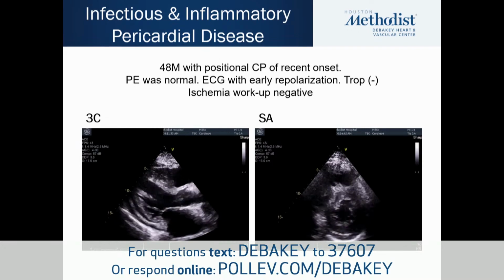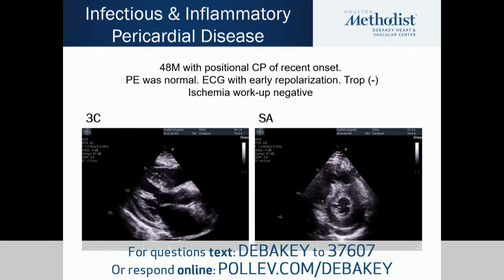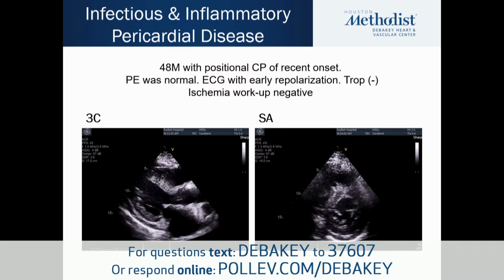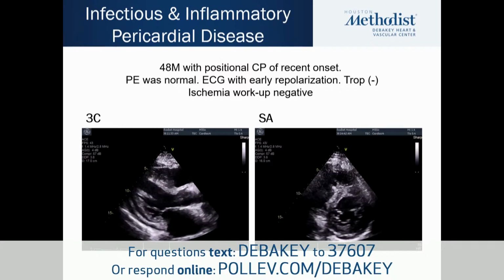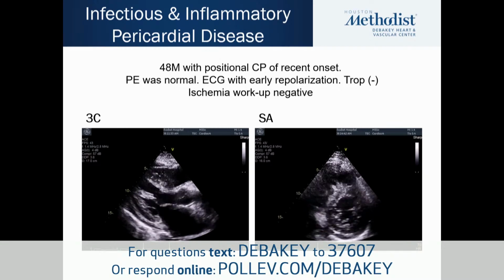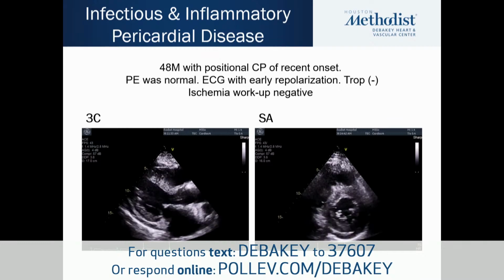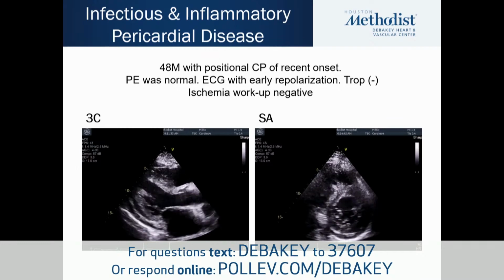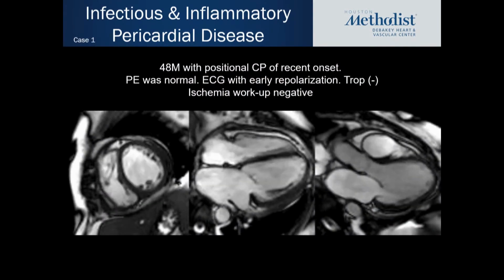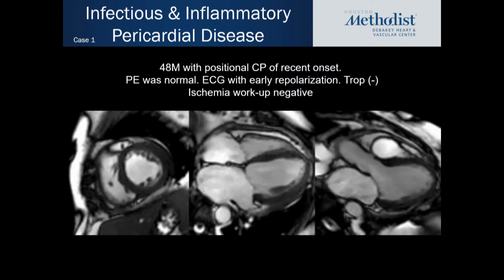And here are his ultrasound images of his heart. I think y'all would agree with me, at least LV size and function look normal. And we see a dark layer just posterior to the LV, posterolaterally. This patient went on to have a CMR, and we'll discuss why, but it's also to show you what our capabilities are with this technique.